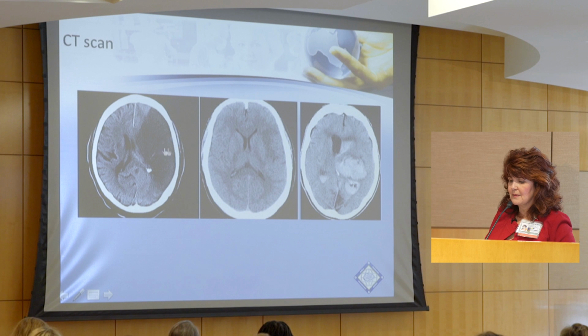If someone said, if I'm over here, my symptoms started an hour and a half ago, maybe, okay. They've got a little bit of hypodensity. If you look at the scan, they've got early hypodensity in the middle cerebral artery territory, but it looks like a branch rather than the entire distribution, right? And then here, they say, my symptoms started an hour ago. What are we doing? Not TPA, right?